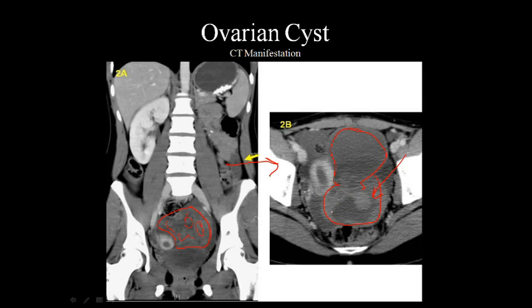And so this really illustrates the necessity of utilizing all types of reconstruction techniques such as axial, coronal, and sagittal. And so this one looks more complex.